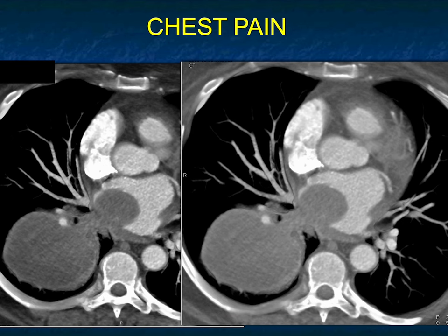Chest pain. Well, there's a large mass in the right lower lung which is extending directly through the pulmonary venous system into the patient's atrium. So you have a tumor in the left atrium. It's not a myxoma, which we typically think about in tumors. It's something that invades in. And the things that invade in can be lung cancer, can be melanoma, and can be sarcomas. So I'd be going with those as the possibilities.